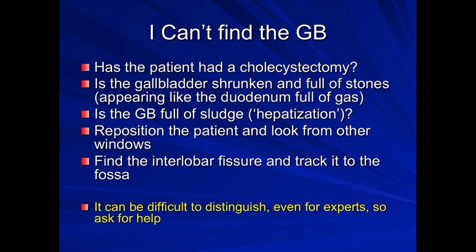But whilst most biliary scanning is fairly straightforward, there are some patients that are just very, very difficult to determine where the gallbladder is and to image it. And so, particularly when you're beginning, don't be afraid to say, I'm not sure, I can't see it, and I need help.